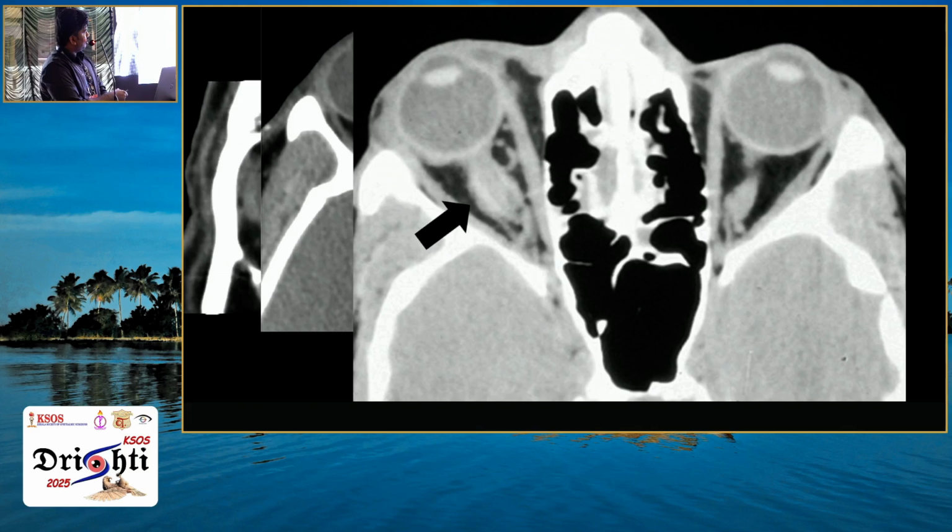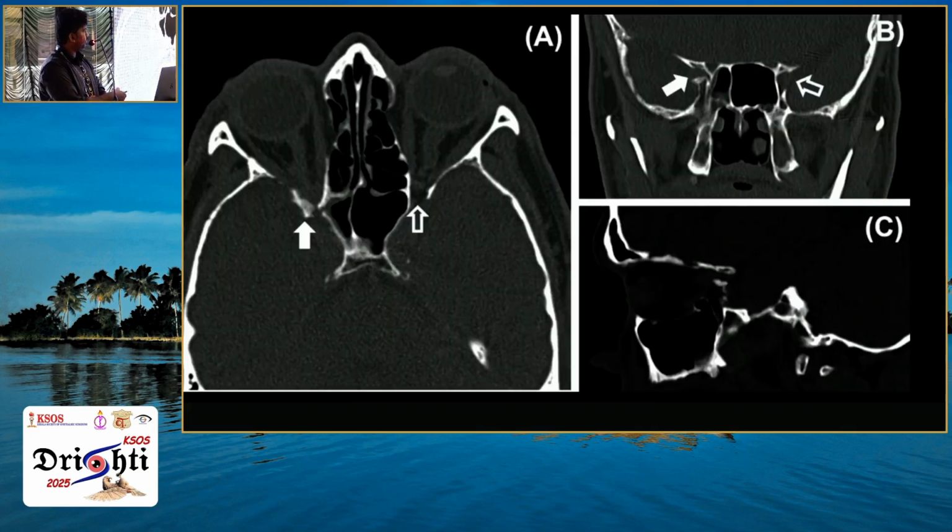Let us go to this, also a trauma case, a CT image in a trauma setting. You can see asymmetric thickening of the optic nerve itself that is appearing very hyperdense on CT, which we do not see like this. Even if the optic nerve is thickened, we do not see it this hyperdense on CT. In a trauma setting, this is suggestive of optic nerve sheath or optic nerve hematoma. Then we have to suspect based on the vision loss. We have to rule out, we have to suggest MRI also to rule out optic nerve transection or anything.